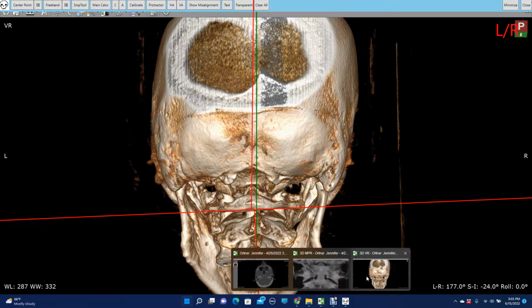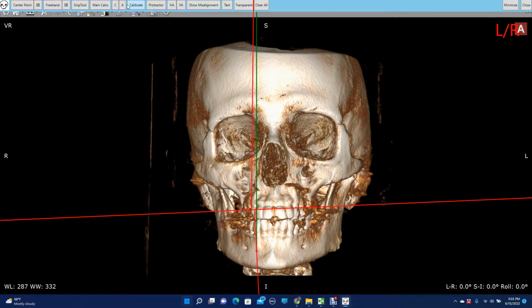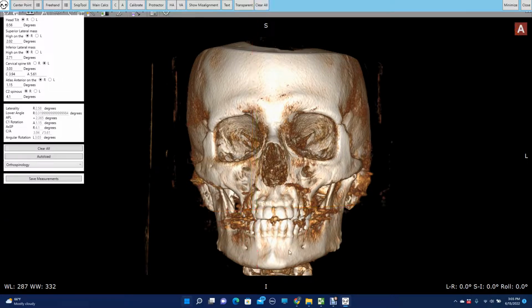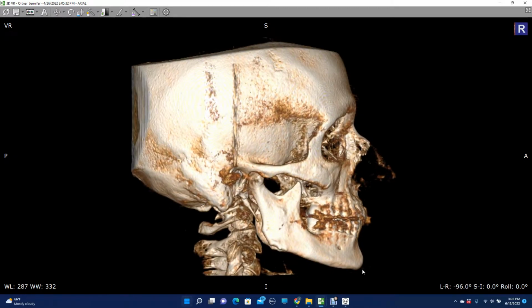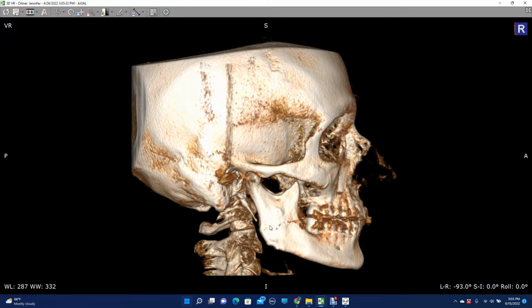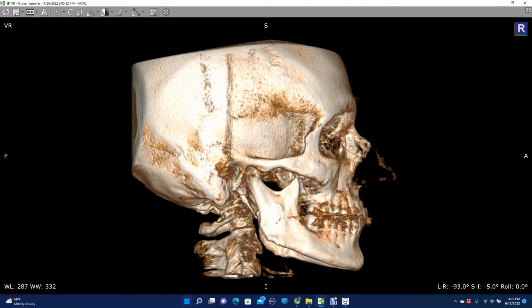Back into Radiant we go, and we know from our analysis that this case is a right laterality, and we will be adjusting them on the right side. Let's take a look at the right transverse process. I like to match the jaw here, and what I mean by that is I see some jaw in the back and some over here. I want those to match up. So I do that to get them matched, and I also do it up and down to get the tilt out. See one jaw here, one jaw there.